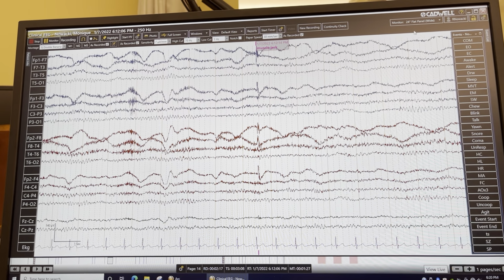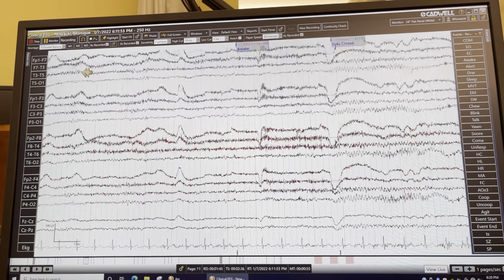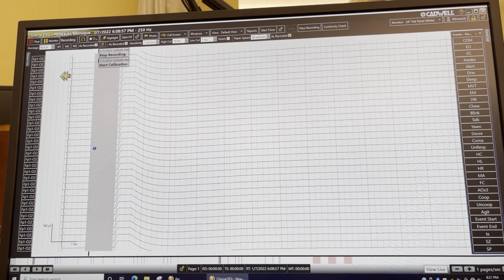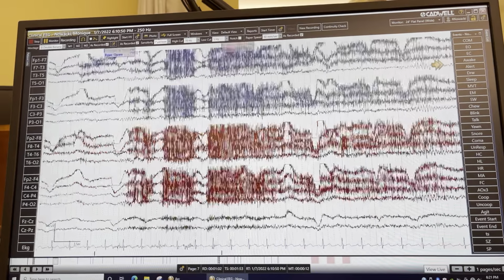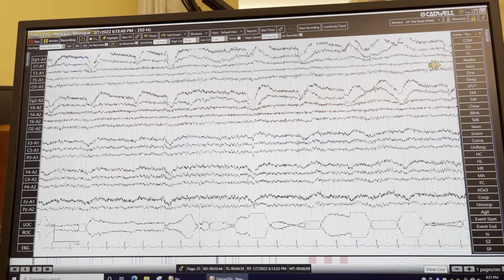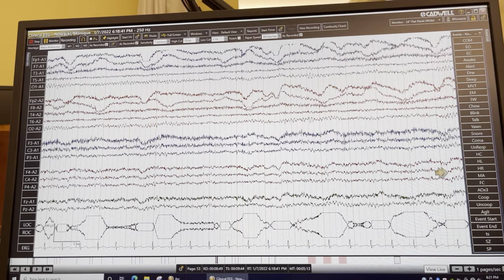If you run your cursor, it has this double arrow, and then all you have to do is click on the left or right cursor, and it'll go whatever way you want. You can also use the arrows on the keyboard to move it too. Okay, and I'm going to go back to view live right there.